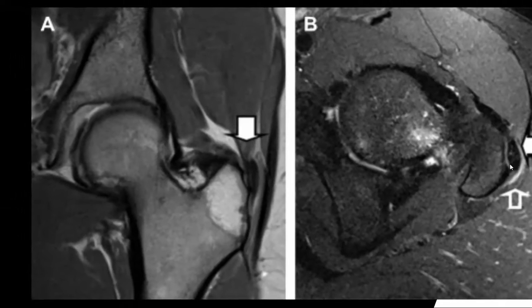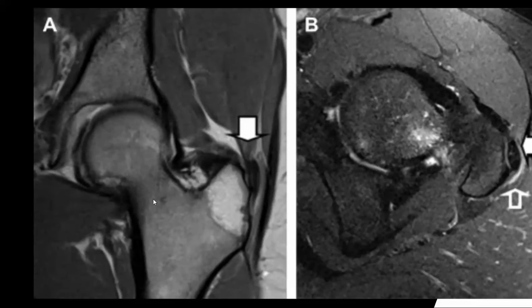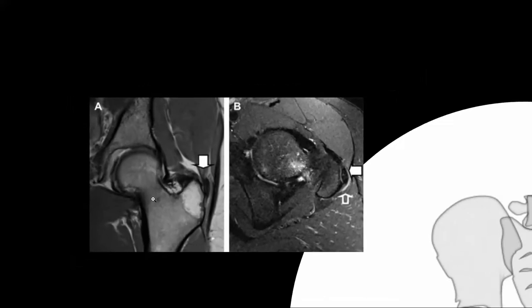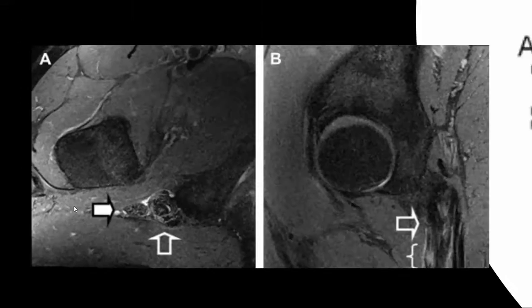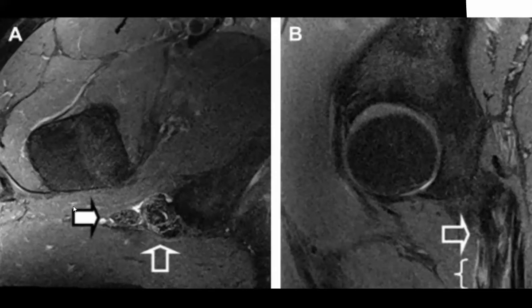which is consistent with peritendinitis. Now the important thing about tendons is that you may send a patient for an MRI, and the report might come back as tendinopathy, but tendinopathy is common and maybe asymptomatic, so it's up to you to determine whether what the report says ties in with how the patient's symptoms are. So treat the patient, not the pictures, is an age-old adage in radiology.